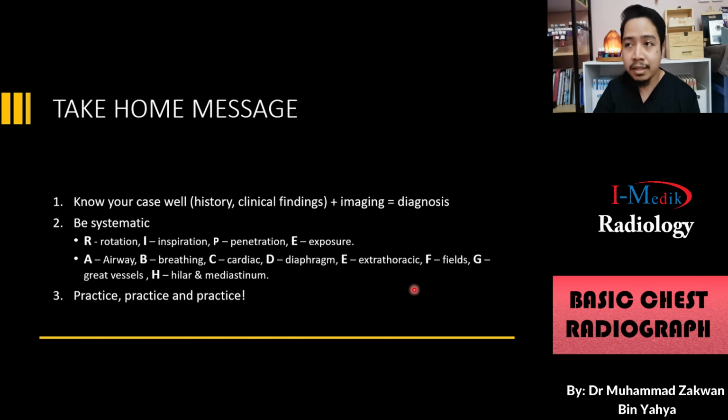Okay, if you only see the chest radiograph without knowing the history, without knowing the clinical findings, it will be very difficult to come out with a certain diagnosis. Okay, so that's one of the reasons your colleagues from the radiology department always ask for the clinical findings or clinical history.